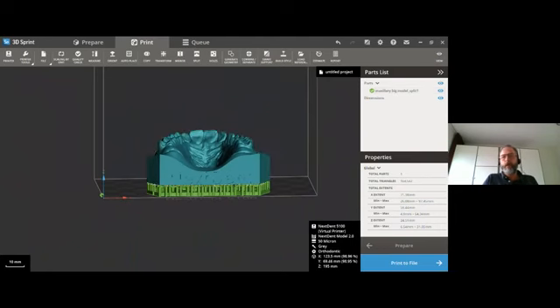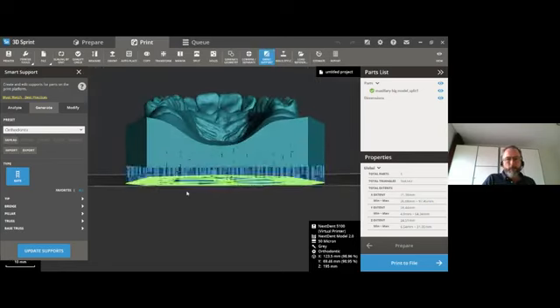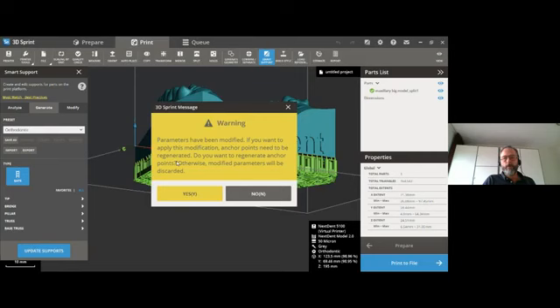Yeah, it's a good question, and they paid attention when I showed this, so this is very good. Yes, if we click orthodontic build style, that means that there's also an orthodontic support style, because the models differ a little bit, and therefore also the different supports. So if you change it, you can see that immediately you get a warning.